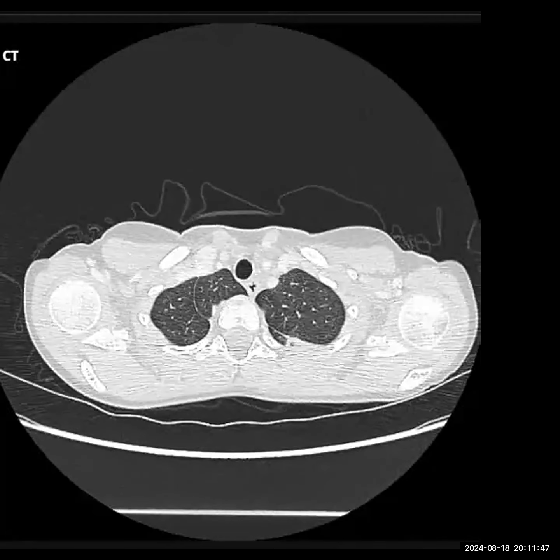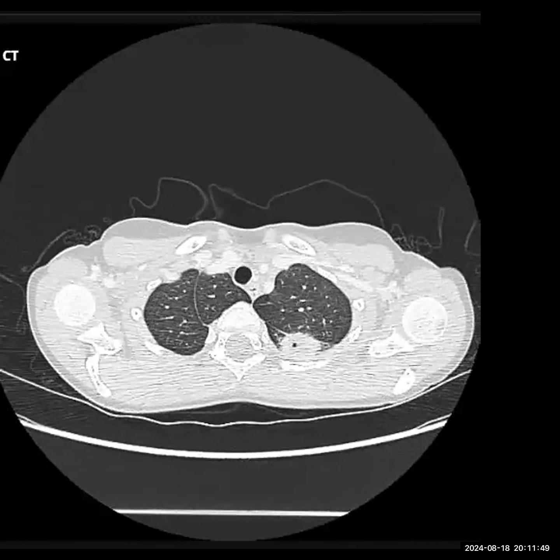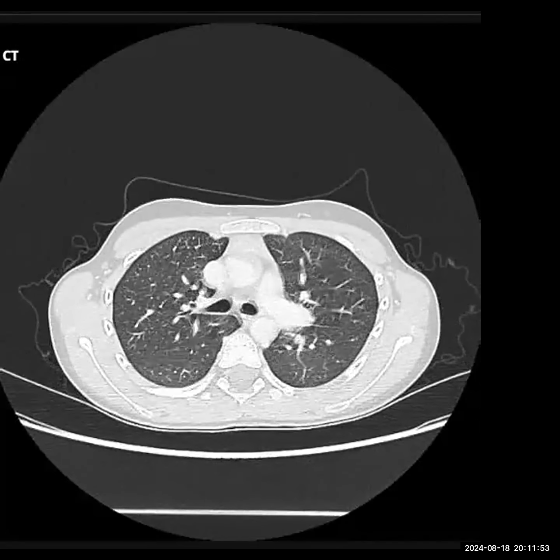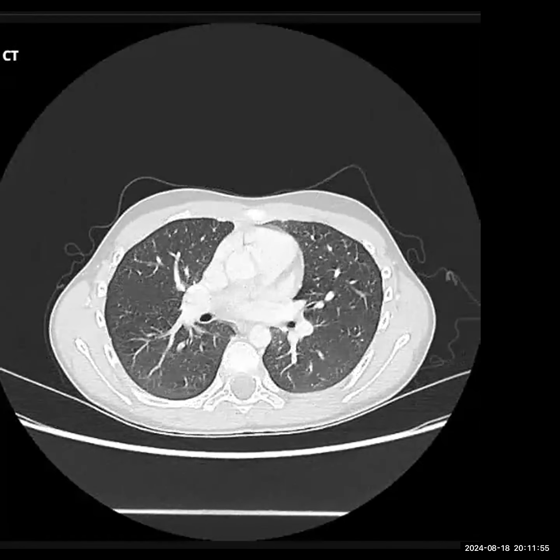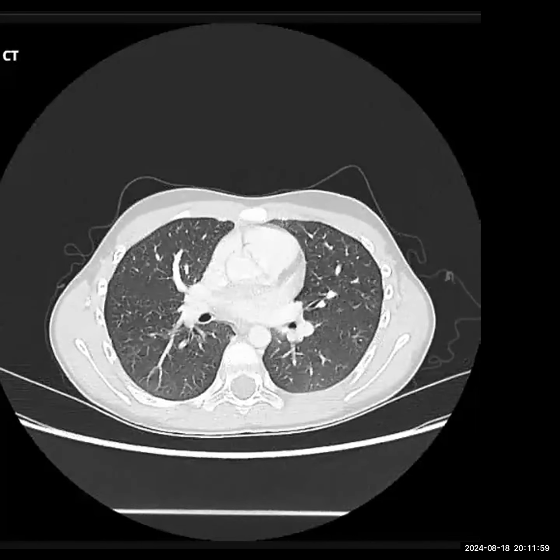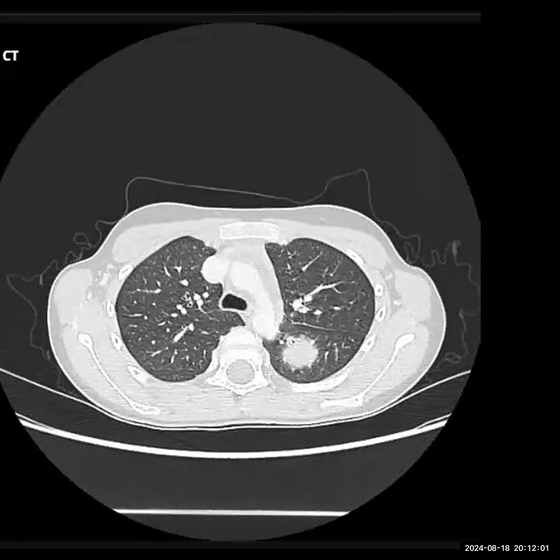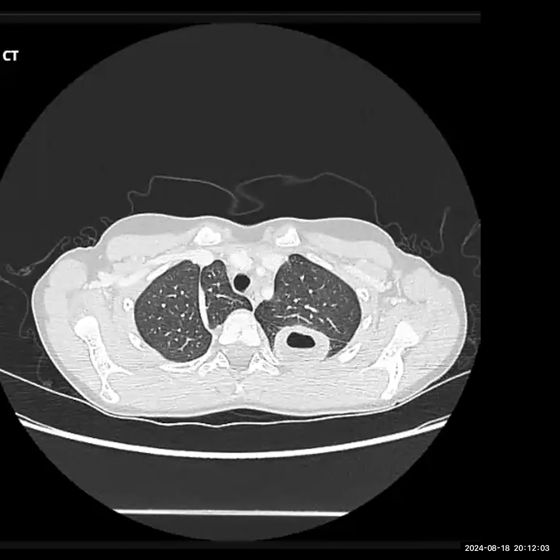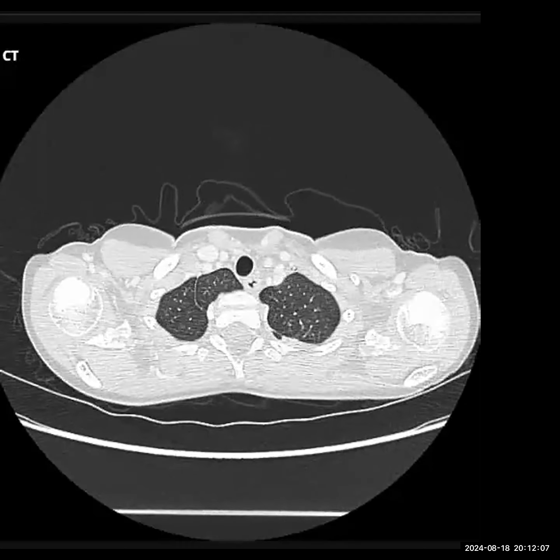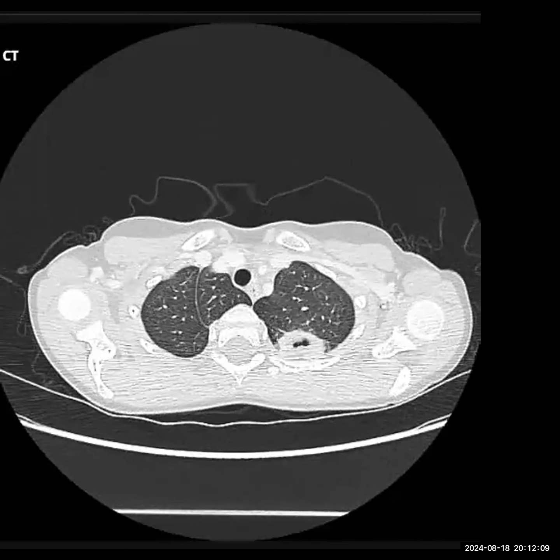And in this, I think there are no lymph nodes. This is most likely looking infective. Yeah, in the absence of lymphadenopathy, I cannot be really sure. So I would convey these findings to the referring clinician. I would raise the possibility of an infective etiology if the patient is having such symptoms.